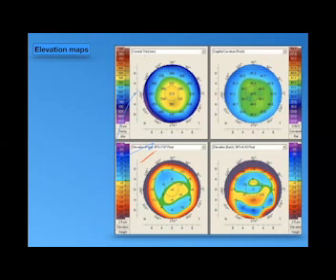There is an imaginary line from one pole of the cornea to the other one, and so the point of the back of the cornea in front of it is expressed by plus, and the point back to it is expressed by minus. So there is protrusion or recession back. Okay, this is the best fit sphere.